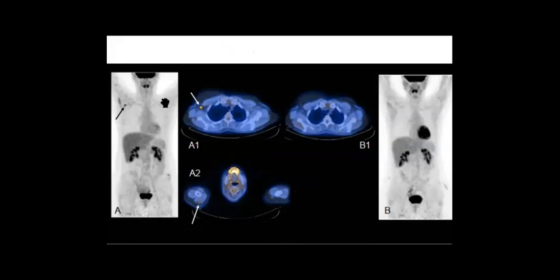This patient did 2 PET CTs, this one and this one. He already has a known primary. Yeah, there is axillary uptake. So this lymph node. So if you find this axillary uptake, if I told you that this patient has a primary and he was treated, what would it be? In your imagination, what would be the first differential?